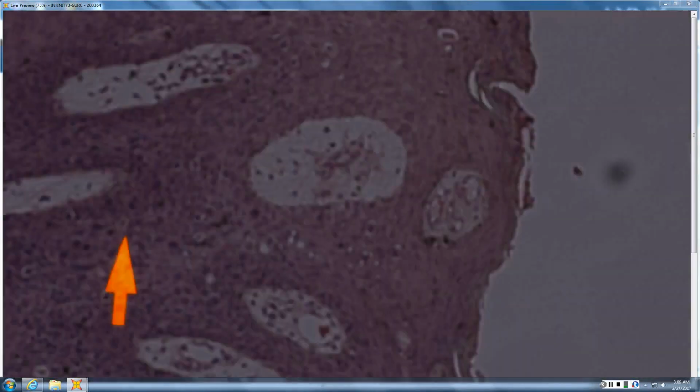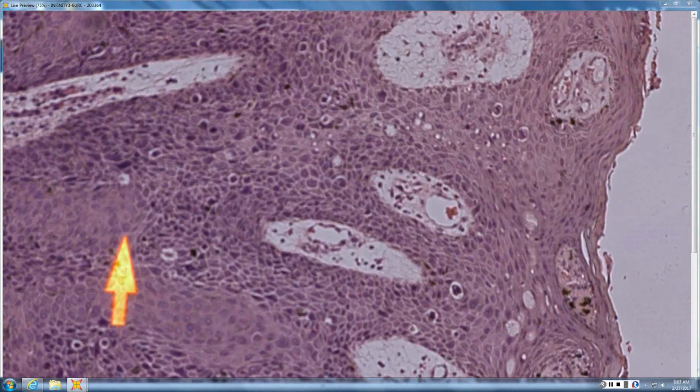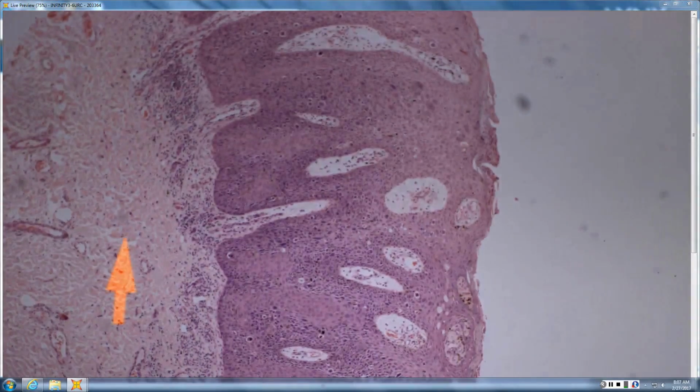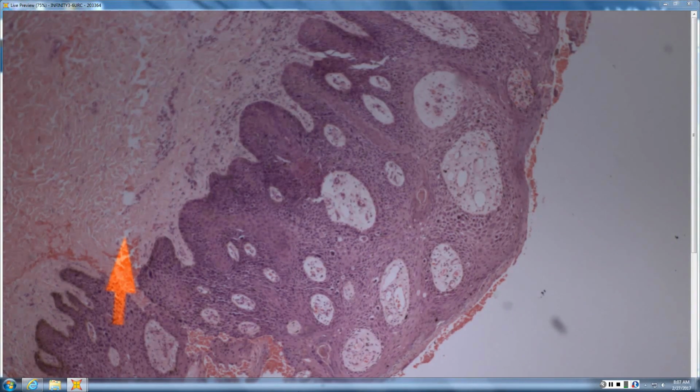So there's definitely atypia in here. There is definitely atypia. And so I would ask where it came from. This comes from a vulva. So my differential histologically is squamous in situ versus Bowenoid papulosis, but I can't tell the difference just on the slide. Well, exactly. So you have to look at the patient clinically. What does the patient look like clinically? The patient has multiple sessile brownish red papules. Then I would be more on the Bowenoid papulosis. But I lied. The patient actually has an expanding velvety plaque. Then she probably has squamous in situ.